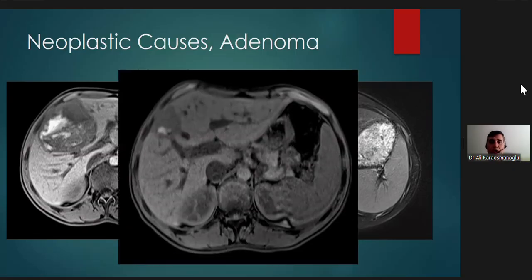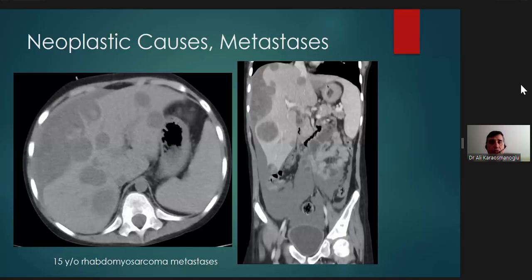So adenoma was confirmed on biopsy, and the patient underwent conservative treatment, and the contraceptive pill use was terminated. Around 15 months after the initial presentation, you can see the regression of the primary tumor with minimal residual hemorrhagic component. This is the follow-up CT, which confirms the regression of the tumor after the cessation of the contraceptive use.